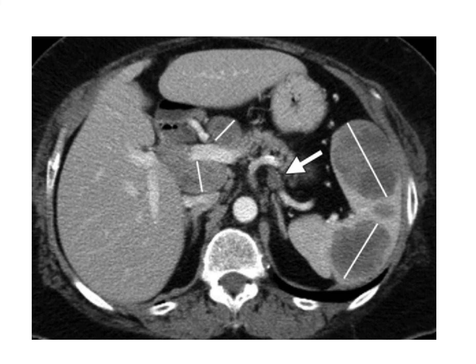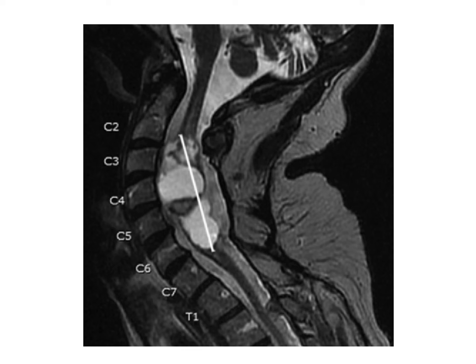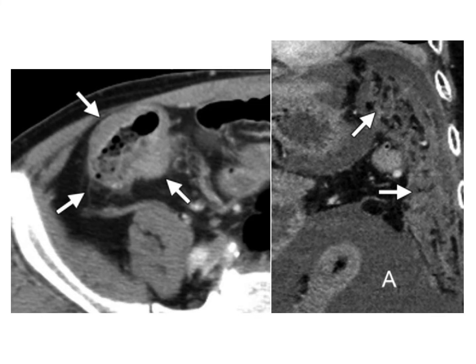You also look at non-measurable disease, so things like omental thickening or something like that, which you can't measure. So this is how you do it. You've got lesions, say, in the spleen, which is in the long axis, nodes, which are short axis, and a small lesion which is below the threshold for measuring. This would be a lesion in the spine, for example, spinal cord, and this would be non-measurable disease. So there's clearly disease, but you can't really put calipers on it.